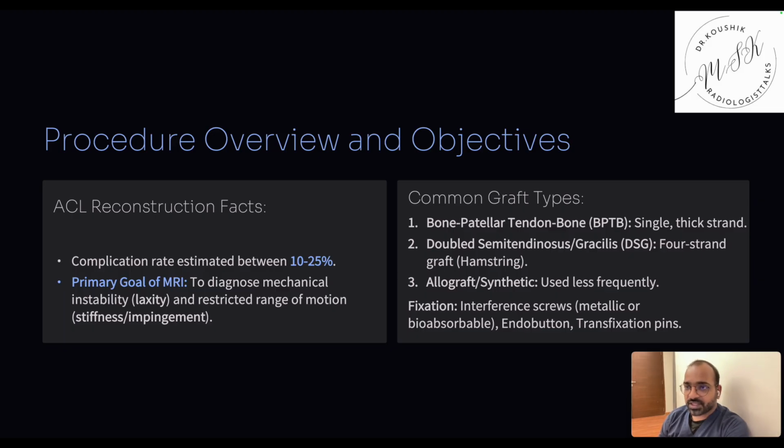The usual fixation is done with interference screws, which can be bioabsorbable or metallic, endo button, and transfixation pins. So these are the fixation devices: interference screw, endo button, transfixation pins.